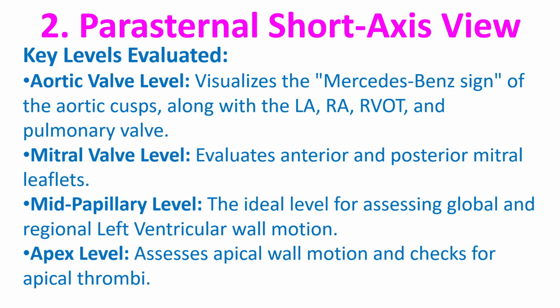Mitral valve level evaluates the anterior and posterior mitral leaflets. Mid-papillary level, the ideal level for assessing global and regional left ventricular wall motion. Apex level assesses apical wall motion and checks for apical thrombi.